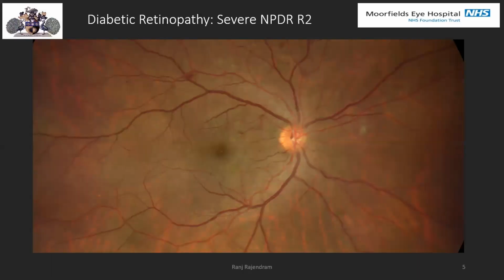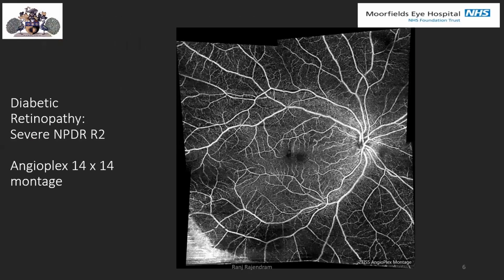So here's a patient with diabetes, typically we see with the Claris. And it's a good record. We some time ago would have done a fluorescein, but we can see some details here, some vascular abnormalities, cotton wool spots and such. And with the angio-OCT, we can do a montage. That takes us out pretty wide to the mid-periphery arcades. We can see some capillary dropout, some vascular abnormalities. And the good thing about the angio-OCT is we can repeat it at regular visits.